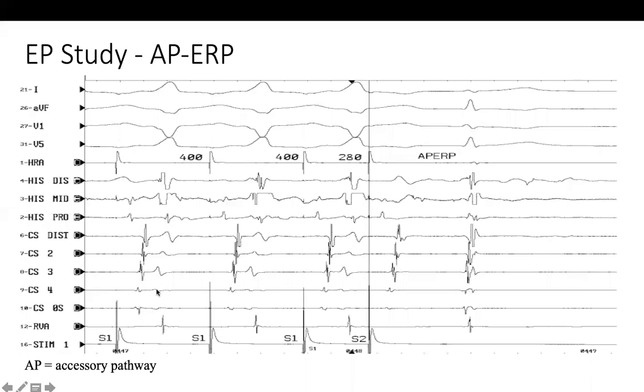So CS 3-4 is probably shorter than the others. It could represent an area of the posterior septum, but we should not ignore the width of the QRS. Ideally, you should see the whole ECG to assess the width of the QRS itself, if it is not here.